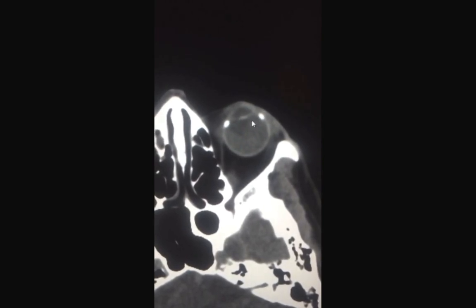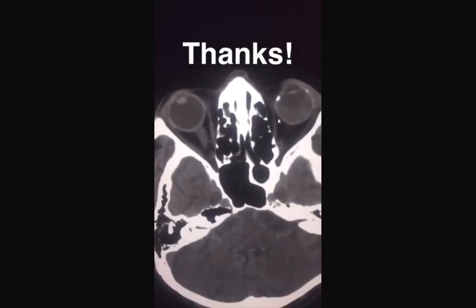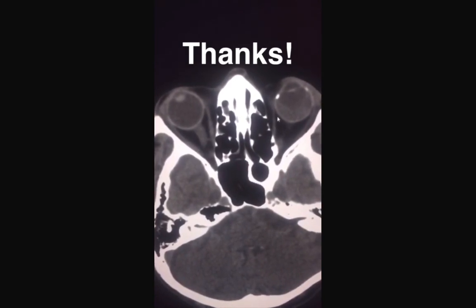So, interesting orbital pathology could be seen on a normal CT scan. Hoping to show you more cases in the future. Thanks.